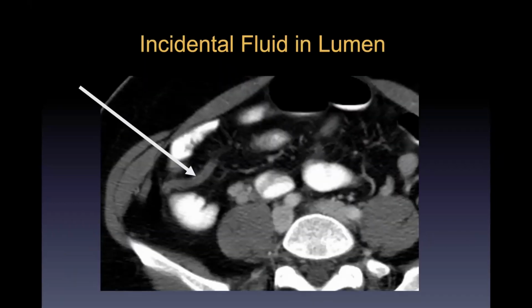Here, an example of just a little bit of incidental fluid in the lumen. So this is one of those normal patients where there's just about a millimeter of fluid filling that lumen. Hopefully this is projecting well on your screens. Just a tiny trace bit. Probably don't need to get too excited about that. It's under that 2.6 millimeter threshold.